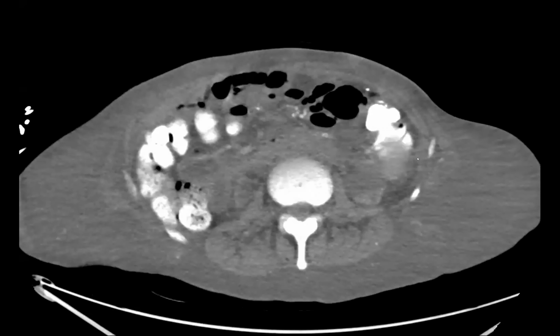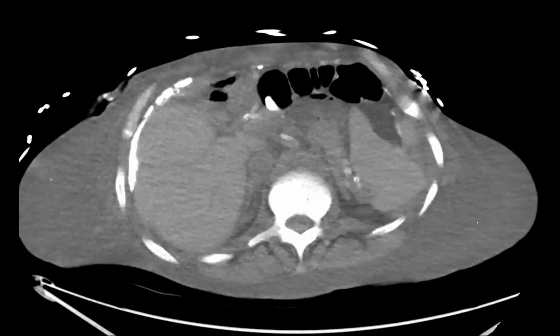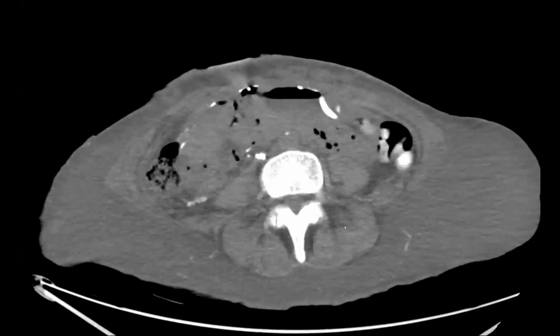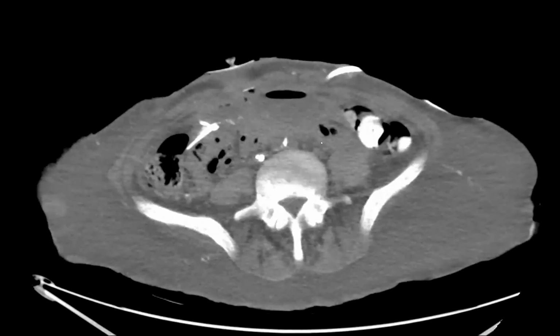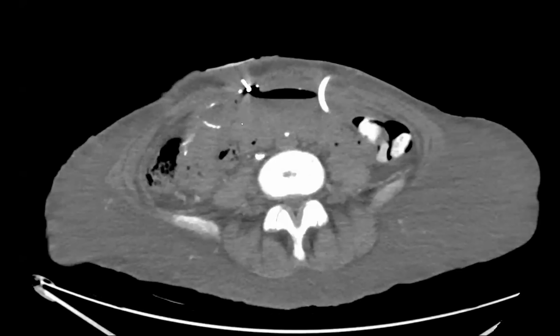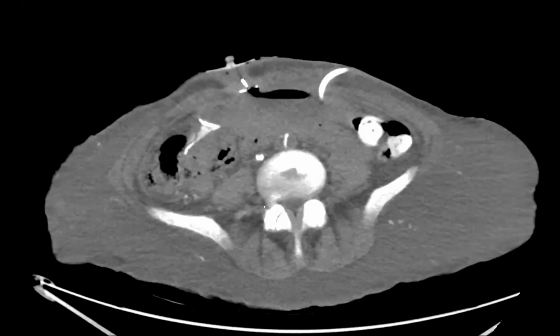Okay, this is a patient with a very complex history. You can see that there's super severe anasarca, and there are some abdominal findings that are very hard to tell given how bad the anasarca is. But my question is, do you guys know what this is? I had not seen one of these until last week when my fellow showed this at our interesting case conference.